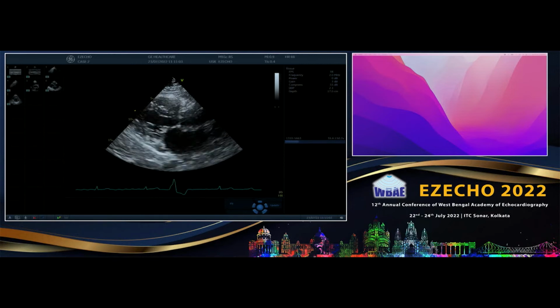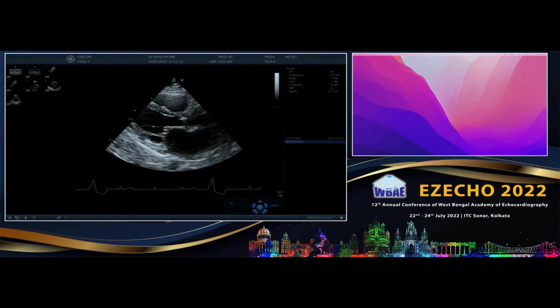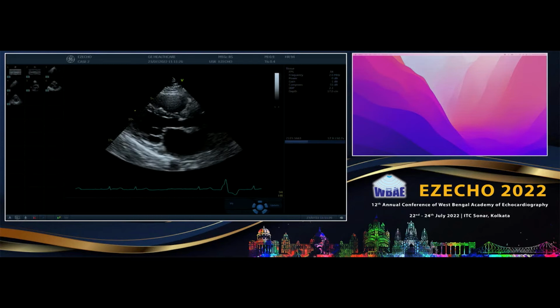So the important thing is that first look at the cardiac volumes, which are actually the HbA1c of LV volume overload for chronic disease, correct? So look at the volume overloads, look at the wall morphology. Even if you know that there is probably an MR looking at the large LV volume, hypercontractile LV, try to look on the 2D image for the mechanism of MR, because now your surgeons are going to repair it, you are going to have people for mitral clips, and so on.